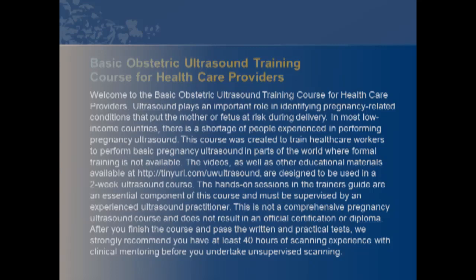Welcome to the Basic Obstetric Ultrasound Training course for healthcare providers. Ultrasound plays an important role in identifying pregnancy-related conditions that put the mother or fetus at risk during delivery. In most low-income countries, there is a shortage of people experienced in performing pregnancy ultrasound. This course was created to train healthcare workers to perform basic pregnancy ultrasound in parts of the world where formal training is not available.